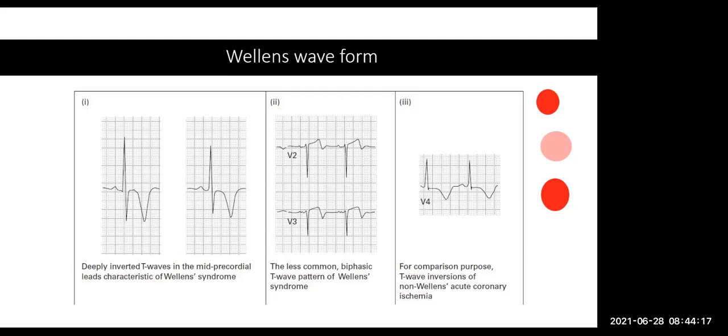Unless you use Opera or something, I don't know what it will tell you there. But on Google and Bing, it shows you Wellens sign, T wave inversion, danger. So you know immediately something's going on. So you start preparing this patient to go in for PCI, right, and angioplasty and stent? Because what's happening is you have an artery that's blocked, that's just been open for a little while, but has the potential to just close up again. And generally, when it closes up the second time or the third time, that's when you have a problem.